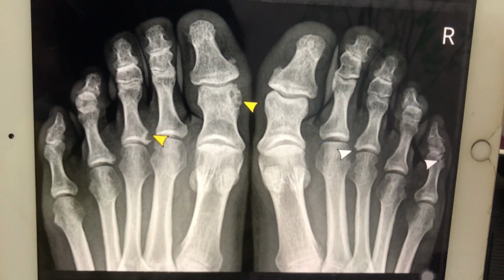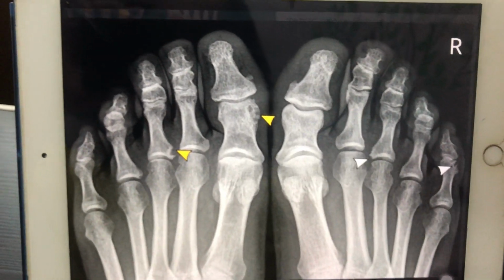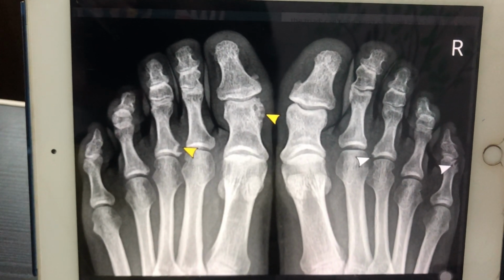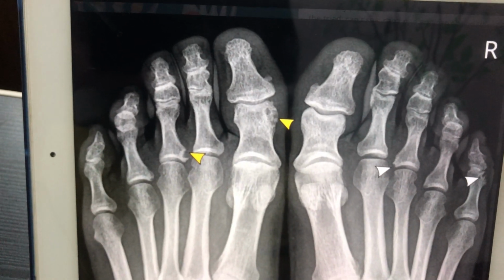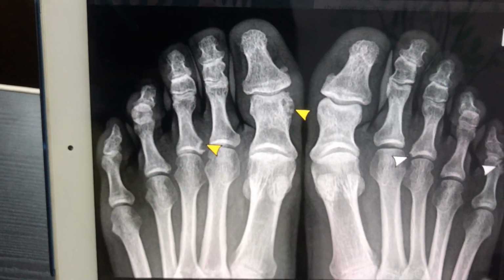Now next we move on to reactive arthritis. Reactive arthritis is essentially a diagnosis of exclusion. We only think of it when there is a definite history of preceding infection. Typically we read Campylobacter jejuni. Now in the late phase of the disease, you can have ill-defined erosions. But one specific feature is that the calcaneum is most commonly involved in reactive arthritis.